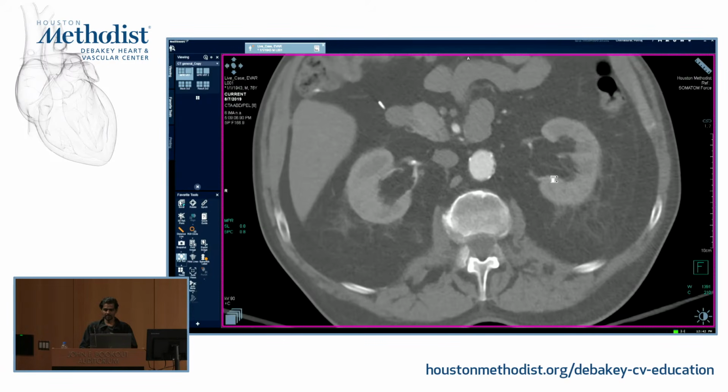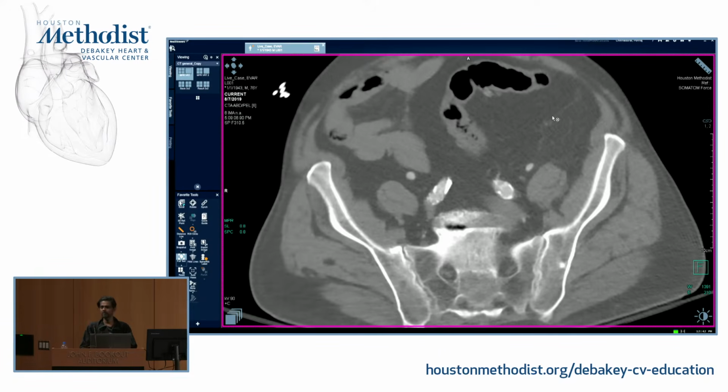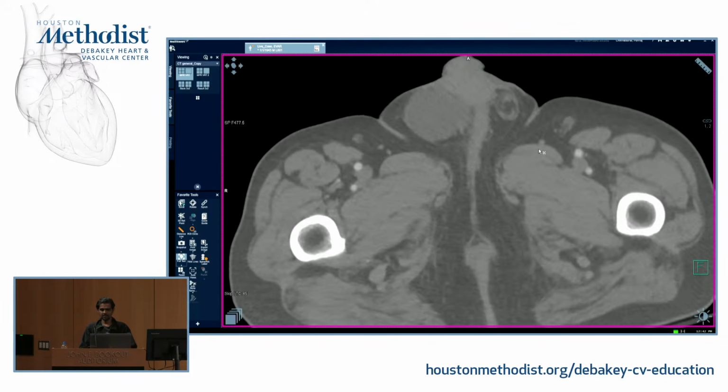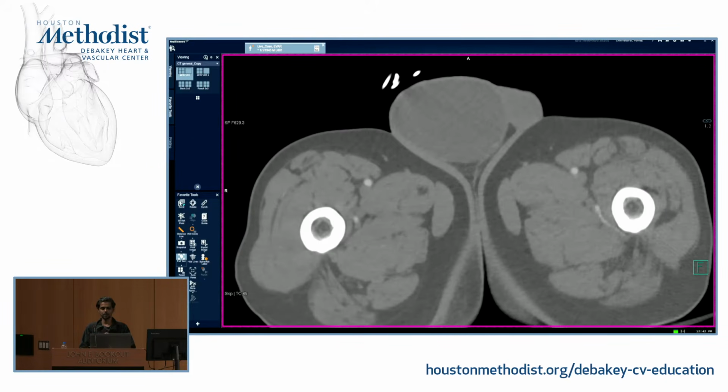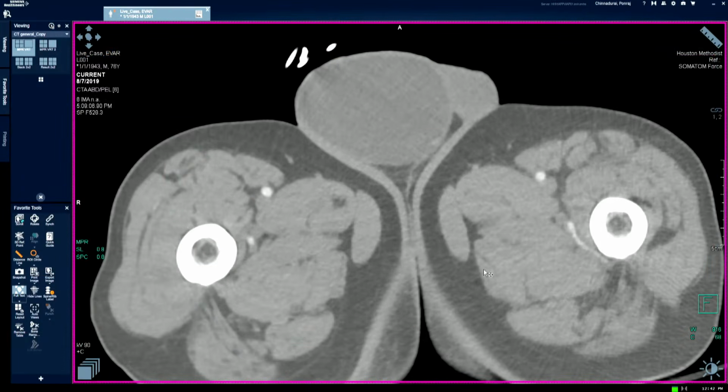Yeah, and since we are talking about that, I'll take you through one more example. I'm not going through the clinical review. I know there was a session on clinical review, but let's say we review this scan from an access standpoint. I'm just going to go back to our angio window, and I'm going to scroll through, maybe pick on one of you guys to just focus on the access. Say you're going to do an EVAR. I'm going to scroll through from the bottom. This is the lowest most slice.